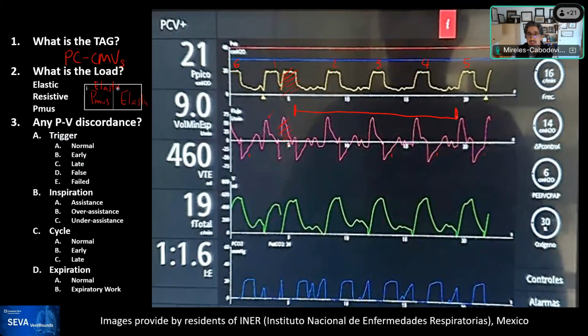So from around this spot here to this spot over here, these breaths are identical. Look at the flow. So the patient exhales, about the same peak expiratory flow, not much change. And then there are two oscillations that cross the baseline, again and again. You see that?